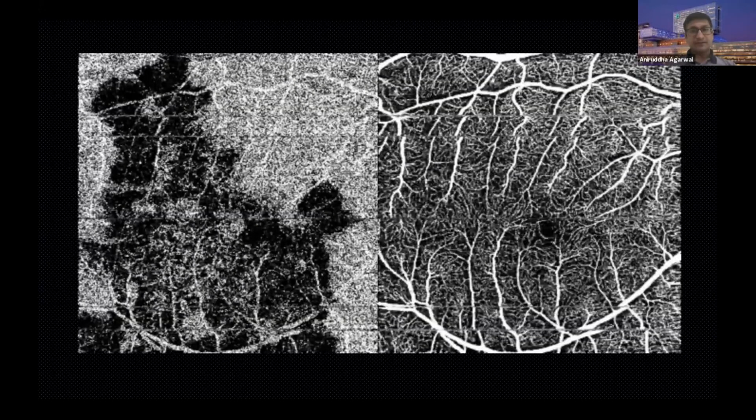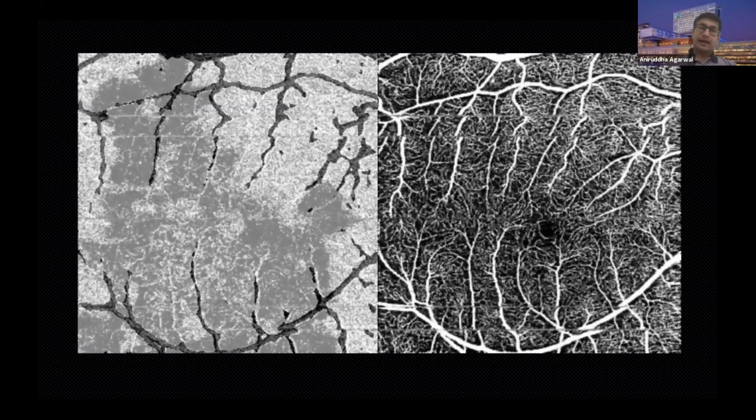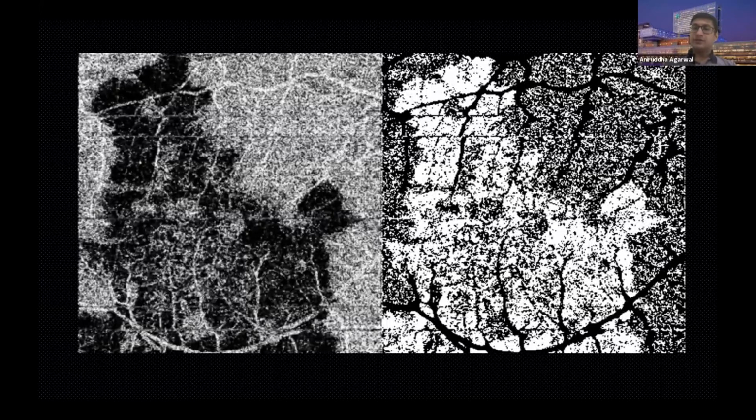Now, there is another way to do the imaging of the choriocapillaris flow deficit and quantify it using en face OCTA. So let's say you have this patient with an en face OCTA. You have the corresponding superficial capillary plexus. Now it's very important to subtract the superficial capillary plexus so that you avoid areas of projection artifact, and you take off these artifacts. What you generate, after using a certain threshold, is a binarized image, and this can give you an automated choriocapillaris flow deficit area.